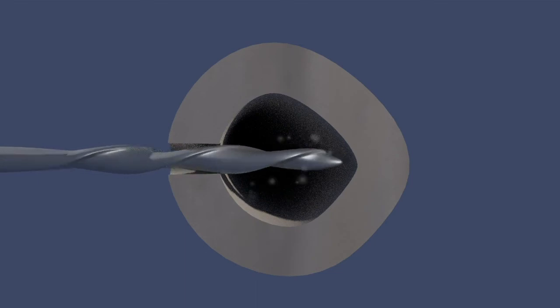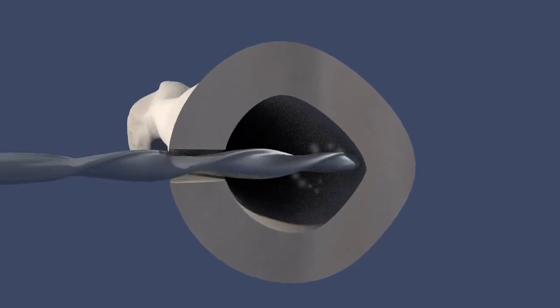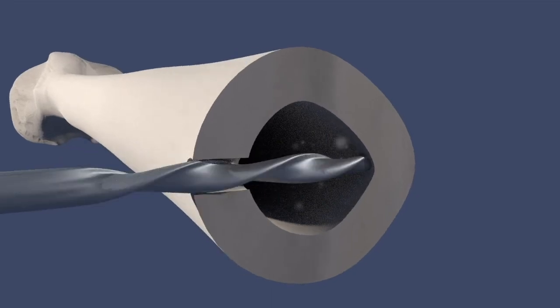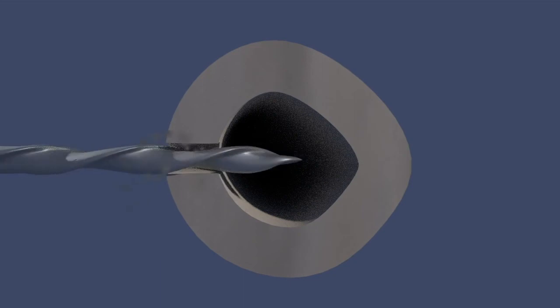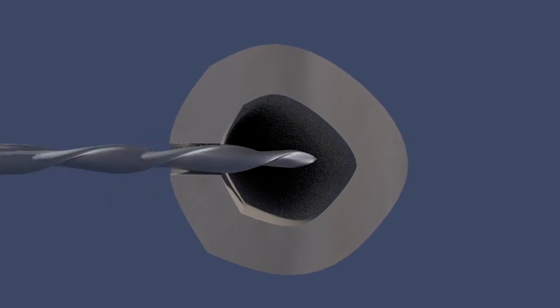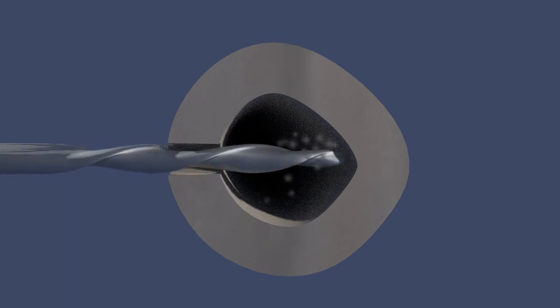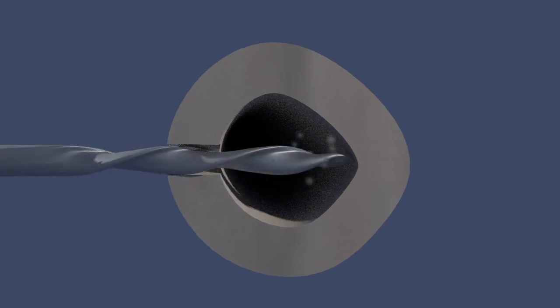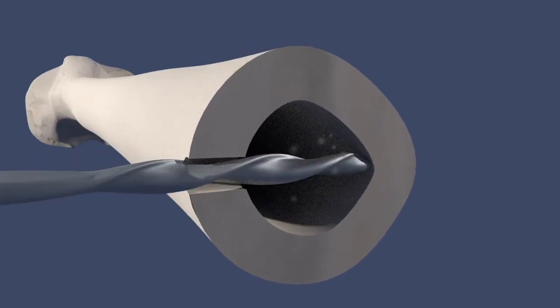In some cases, or in most cases, plunging is dangerous, especially on the far cortex because of the anatomical structures that can be injured. The canal itself is safe to drill across, so if you plunge into the canal, you'll just hit the far cortex. But practicing not to plunge on the near cortex will help you develop control necessary to avoid the plunging on the far cortex.